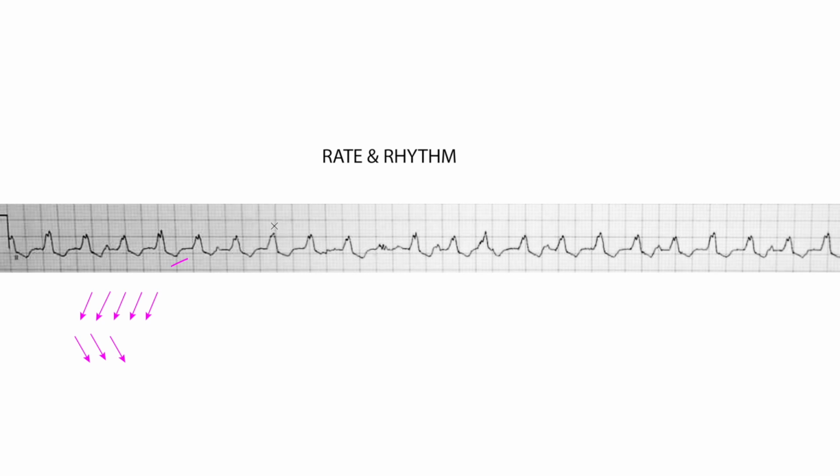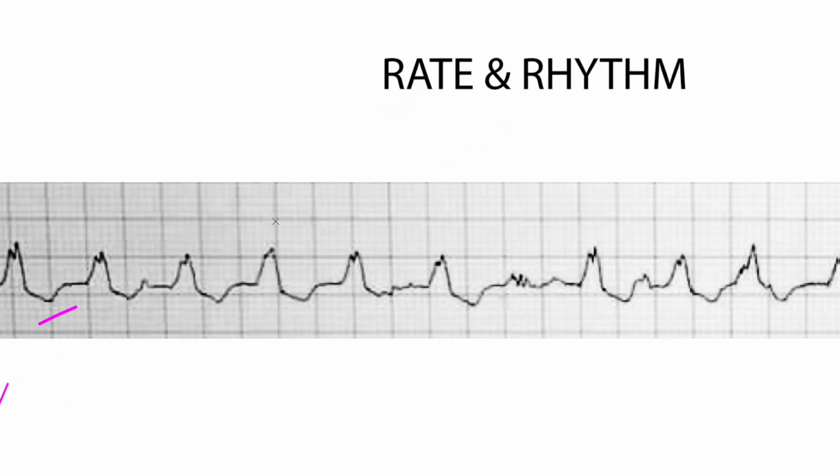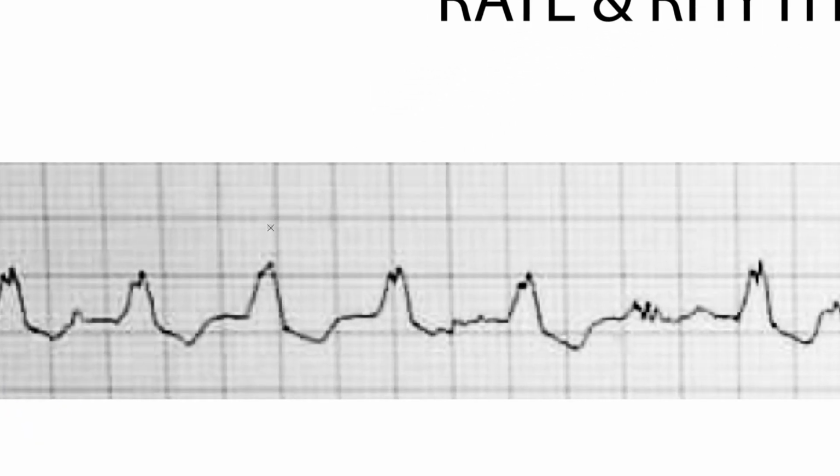So first thing I'm going to do is try and get the ventricular rate, or the heartbeat rate, right? Ventricles are what squeezes the blood into the system, so that's the rate that's most significant to us most of the time. So just quick and dirty, okay? Just R to R, peak of R to roughly peak of R. This is 300, 150, a little bit less. I would say that our ventricular response is at 140 beats per minute.